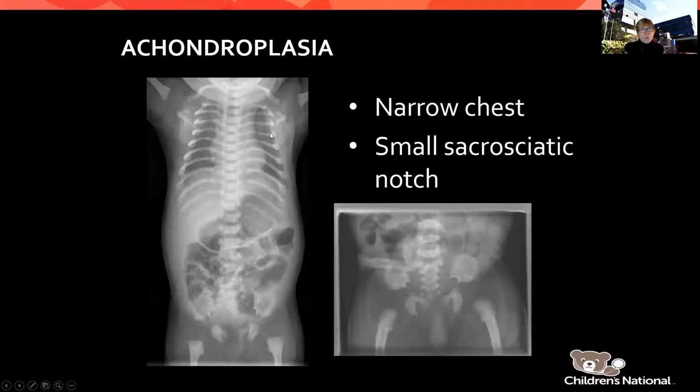Chest and rib size can be a little hard. If it's subtle, I think at times we are not really very good at saying we think the ribs are short. You want to make sure, because a lot of the cartilage courses anteriorly. You may get skeletal surveys with a very obvious small chest on your clinical exam, and we may not necessarily mention what the ribs look like.